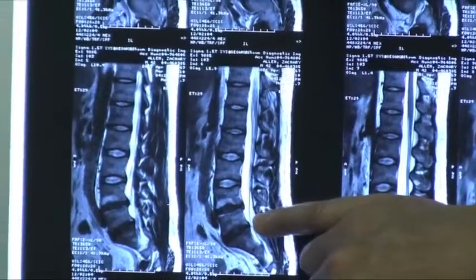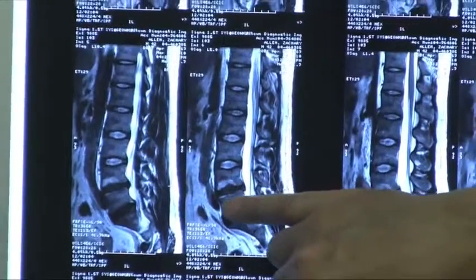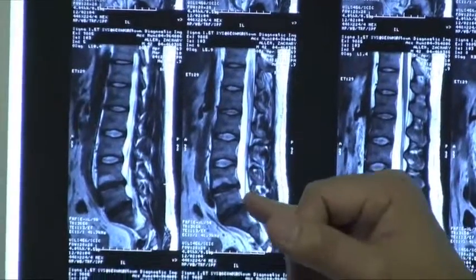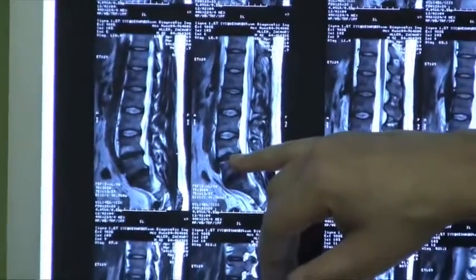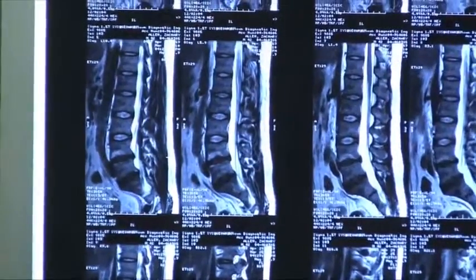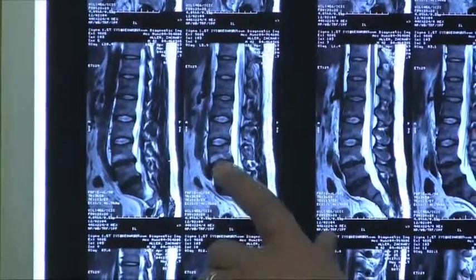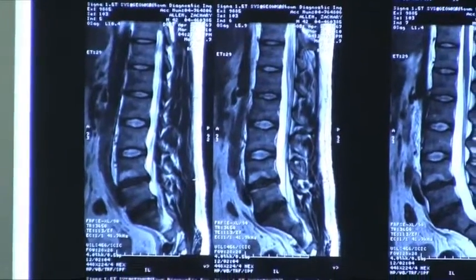Also, you notice in this one, there's some white here in the bone. Oftentimes when there is disc herniation or disc pathology and you don't have proper exchange of fluids across the end plate to the bone and the disc itself, you'll get what we call Modic changes, or swelling within the bone itself, that shows up as white in color also.